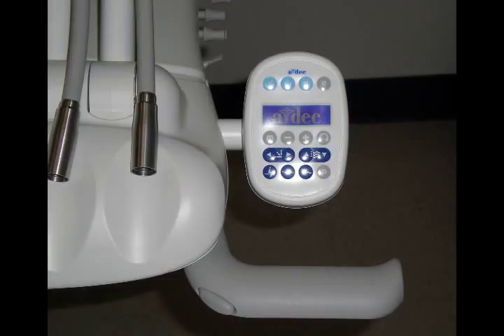The air brake will function as a handle and will allow you to move the delivery system into different positions. The air brake handle has a button that will allow the positioning of the delivery system vertically. When you push the button in and hold it, you can move the delivery system up and down freely. Once the delivery system has been moved to the desired position, you release the button and the delivery system stays in that position vertically.